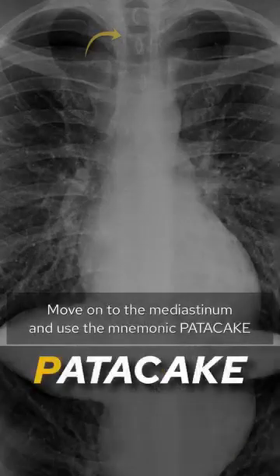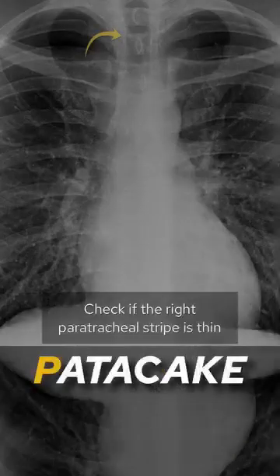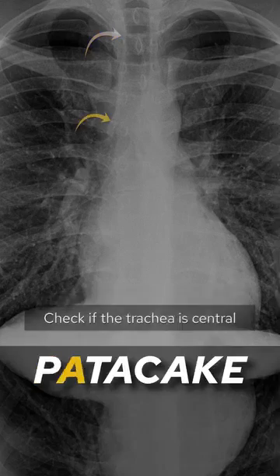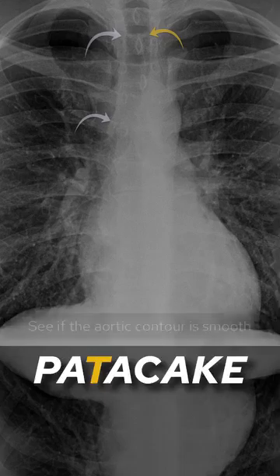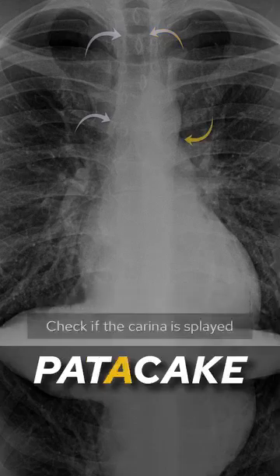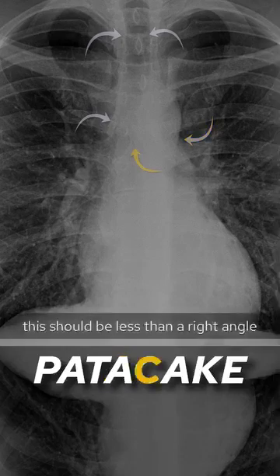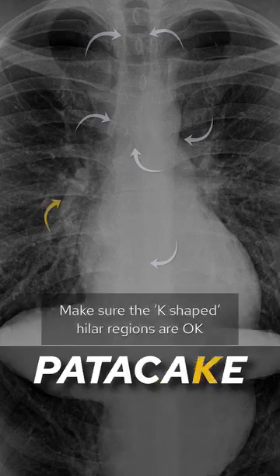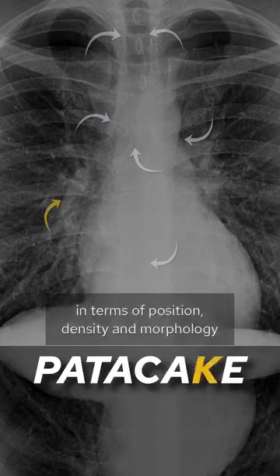Move on to the mediastinum and use the mnemonic PATACAKE. Check if the right paratracheal stripe is thin, make sure the azygos vein contour is small, check if the trachea is central, see if the aortic contour is smooth and you can see a concavity at the AP window, check if the carina is splayed and it should be less than a right angle. Look for the azygoesophageal recess if you can see it, and make sure the K-shaped hilar regions are okay in terms of position, density and morphology.